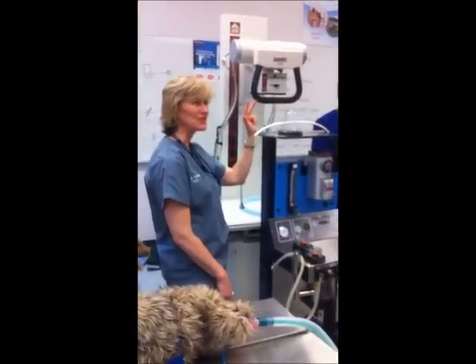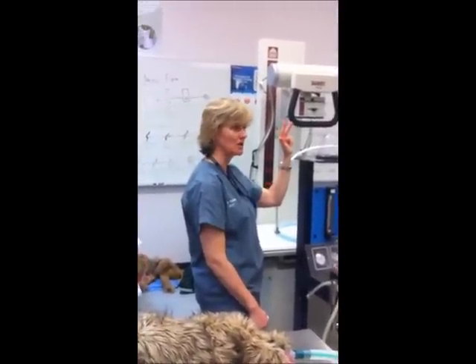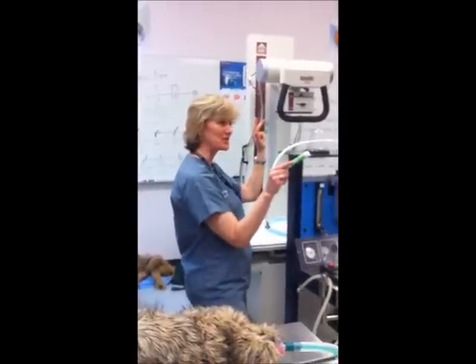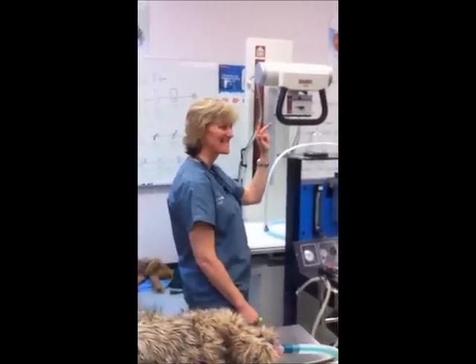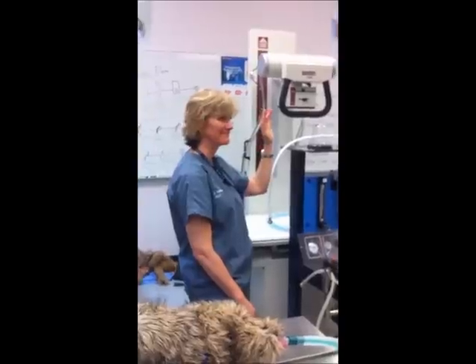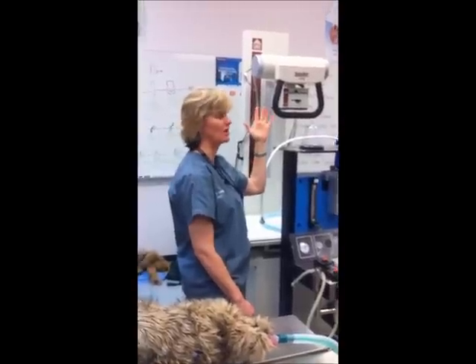Catheters are not so much monitoring equipment as something you would use in induction, but know what you need to have in induction. Know how you would prep an animal for surgery. This is everything we've done in the last few weeks. What is the respiratory piece of equipment called? The apnea alert. There's one other obvious one. Thermometer. So there are 5 pieces of monitoring equipment there. You might be asked that somewhere along the way, so know that.